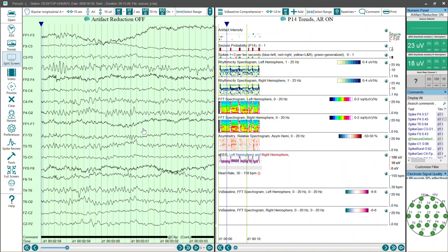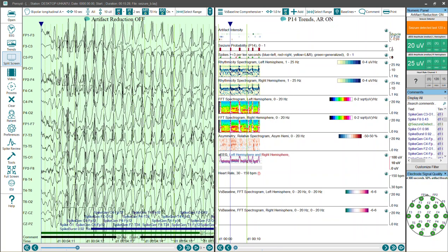I have a short recording open. This is a little over 15 minutes, and we'll just use this as an example. This is a record that has some interspersed spike and wave seizures.